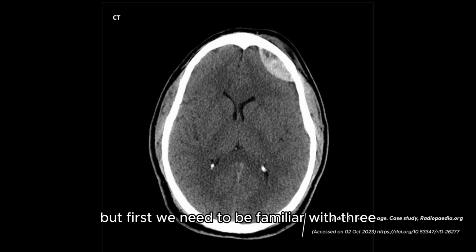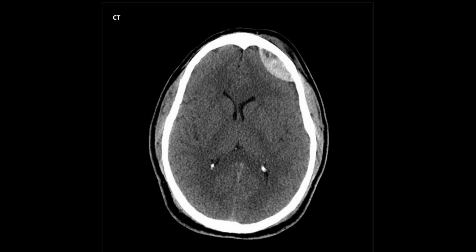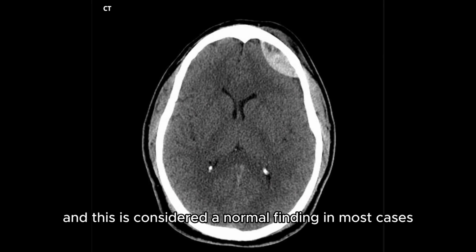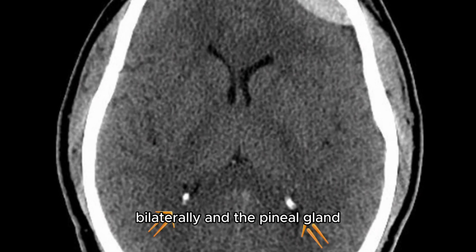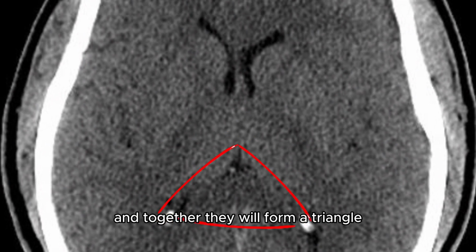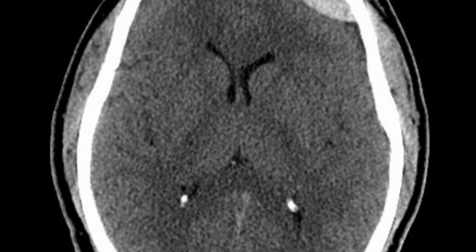But first, we need to be familiar with calcification seen in vast majority of cases. And this is considered a normal finding in most cases. These are calcifications in the choroid plexus bilaterally and the pineal gland, and together they will form a triangle. It's important not to confuse these with a hematoma.